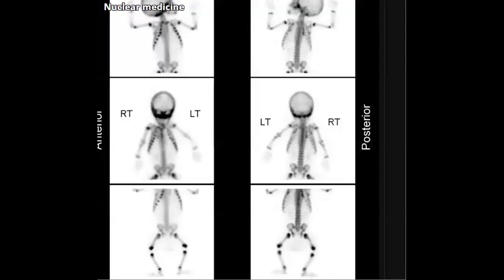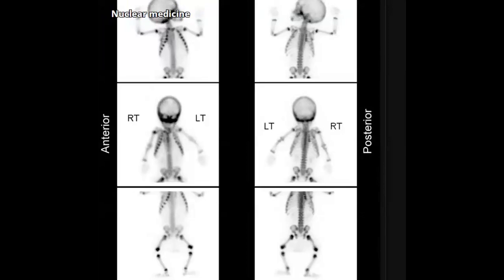Let's go more, a bit more difficult. This patient is 6 weeks, years old, and you have this pattern in the bone scan. What do you think? Where is the abnormality? We need to focus more on the abnormality. Let's focus more. Yes. Where is the abnormality?